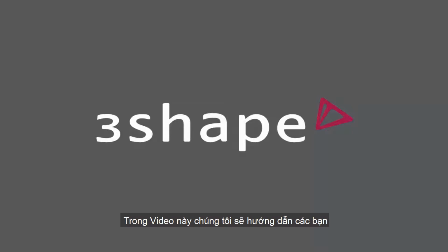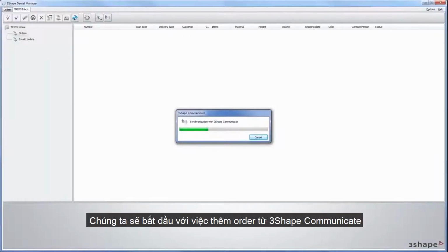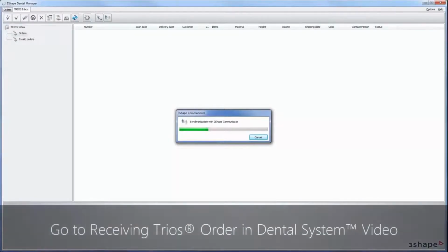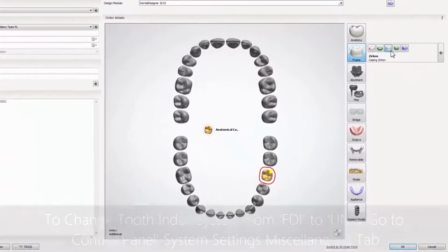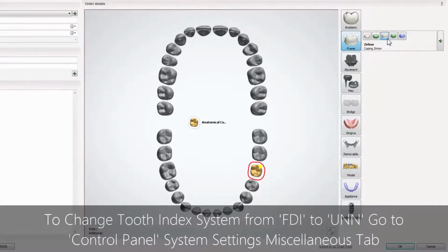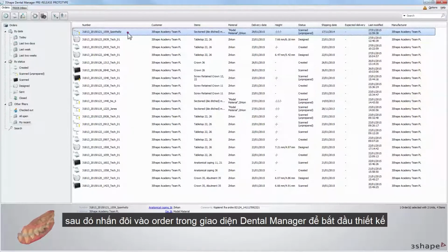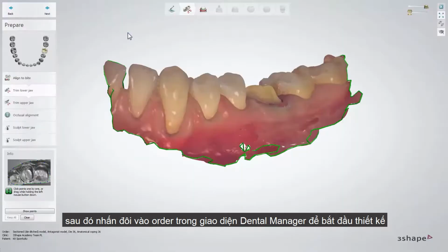In this video we will show you how to design an anatomical coping on a Trios scan. Start with importing your order from 3Shape Communicate. Once your order is ready, click OK. Then double-click on your order in Dental Manager to open the order in Dental Designer.